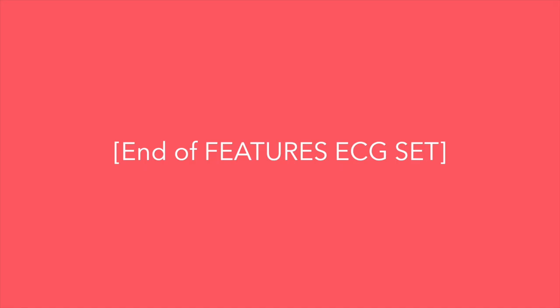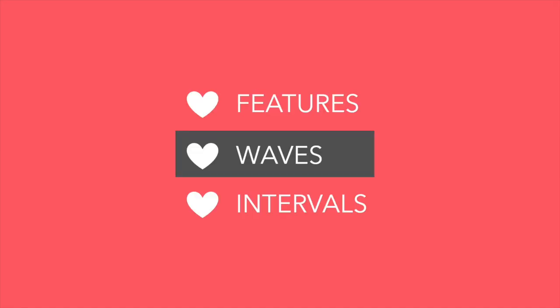Congratulations, you've reached the end of the features ECG set. Hooray! Next up is waves.